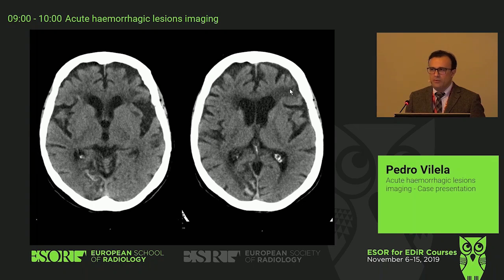Not really. Hemianopsia homonyma. So this would be a lesion where? Occipital. Okay? So the patient has maybe an infarction here, because it goes into the cortical area, have small vessel white matter disease, as you see here. And what is happening on the occipital lobe? There is this hyperintense change in the right occipital area. And this would explain the symptoms.